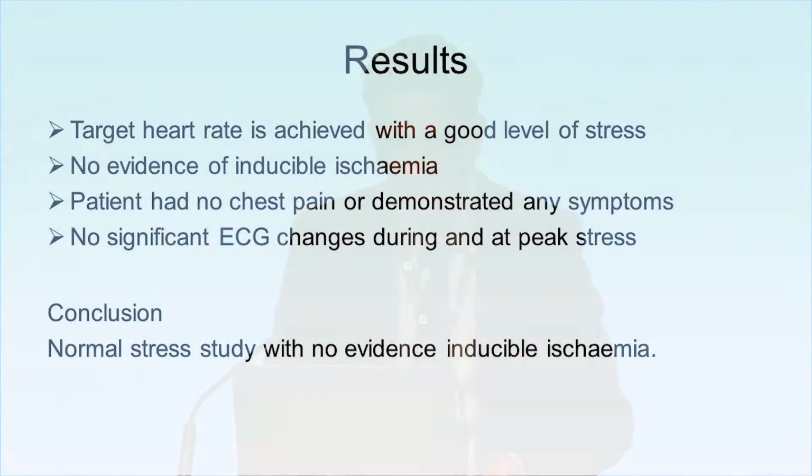So the results of this demonstrated that target heart rate was achieved, good level of stress was achieved, no evidence of ischemia, patient had no chest pain, demonstrated with no symptoms. Normal ECG at rest and peak, essentially a normal study.